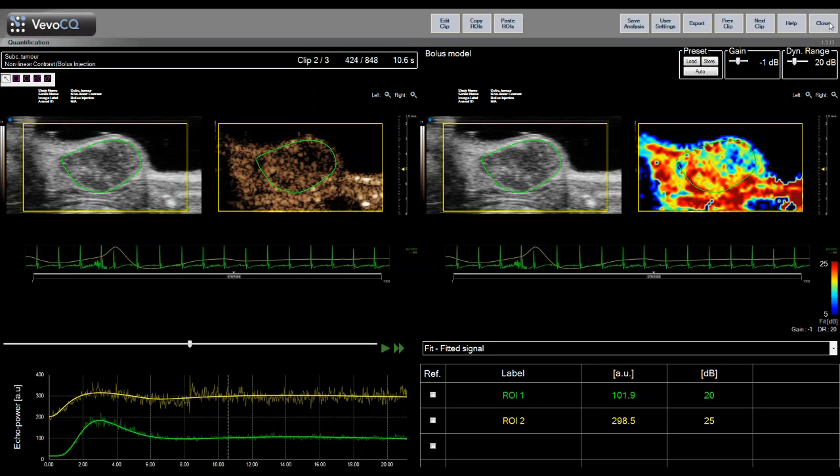Sorry, I'm just trying to. Oh, sorry. No, I found the button. I just had to hide the webinar sidebar here so that I can actually see the data that I'm showing you.